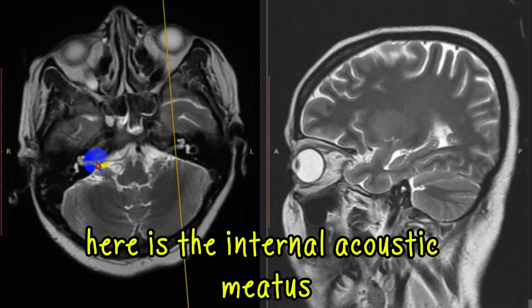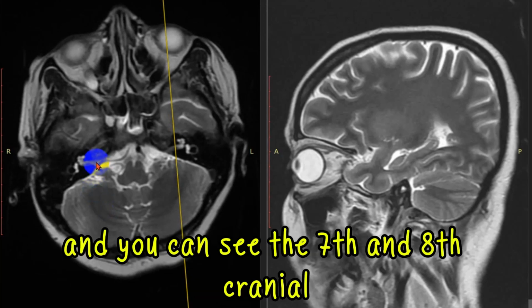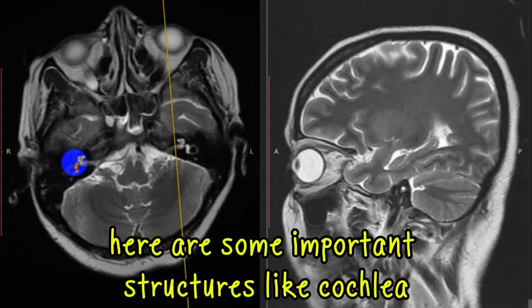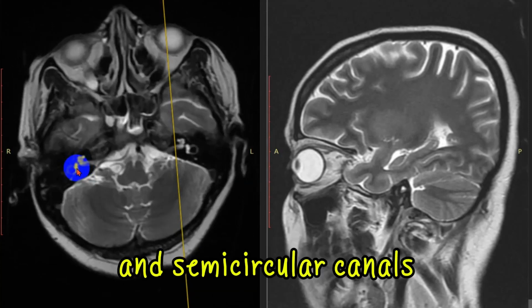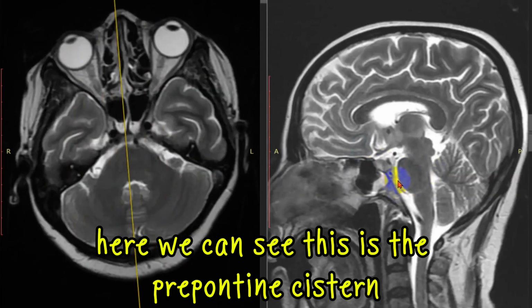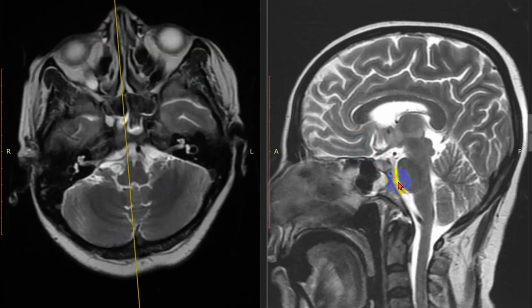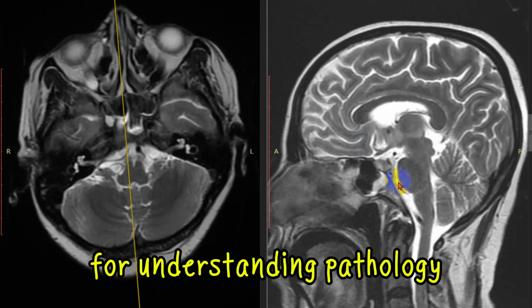Here is the internal acoustic meatus. Here you can see the 7th and 8th cranial nerves enter through this internal acoustic meatus. Here are some important structures like the cochlea and semicircular canals. Here we can see this is the prepontine cistern. These structures are very important for understanding pathology.